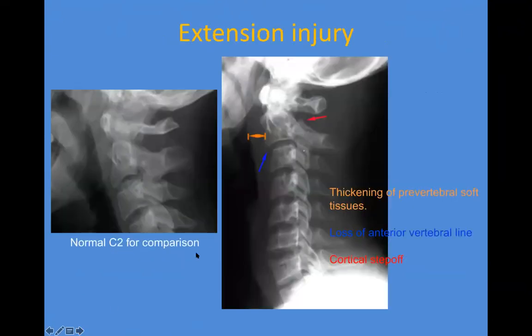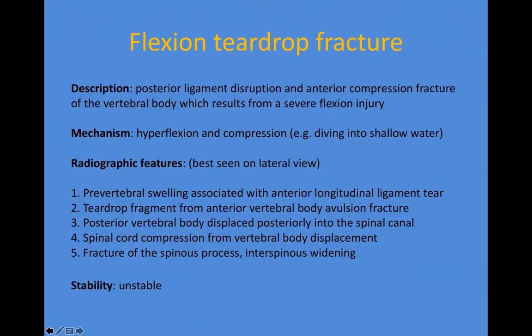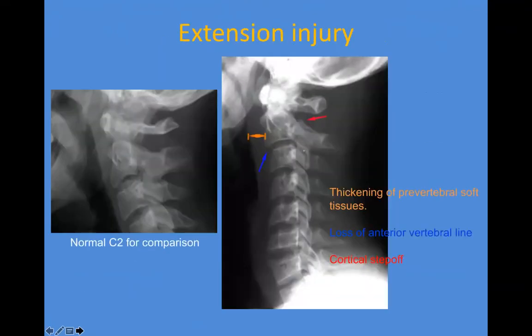Here's another example. Oh, sorry, not another example of that. An example of an extension injury. So here's a normal film on the left for comparison.